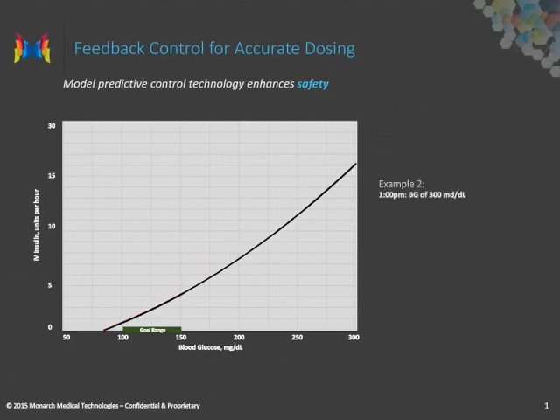If, on the other hand, the patient response demonstrates an unexpected sensitivity to insulin, and the initial glucose drops from 300 to 200 milligrams per deciliter, the system downregulates the curve to match the patient's sensitivity and recommends 7 units. This adaptation occurs with each entry.